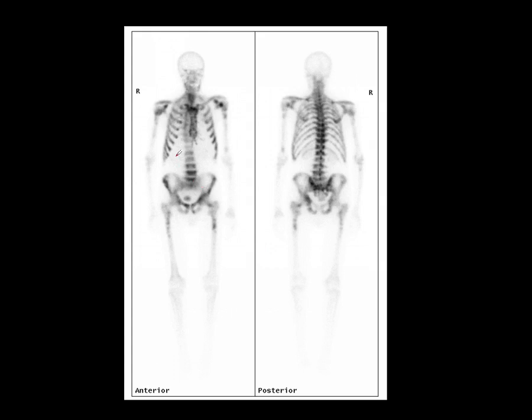So we have widespread activity throughout the ribs, spine, focal areas in the humeri and femora, but the impression is of lesions coalescing together so they form one homogeneous area of increased activity within the axial and proximal appendicular skeleton. And what we mean by that is spine, ribs, pelvis, and proximal long bones. Essentially the area where an adult patient will still have some hematopoietic marrow.